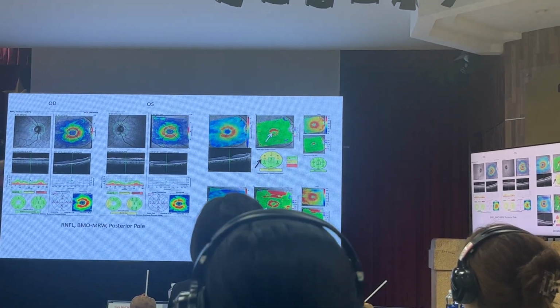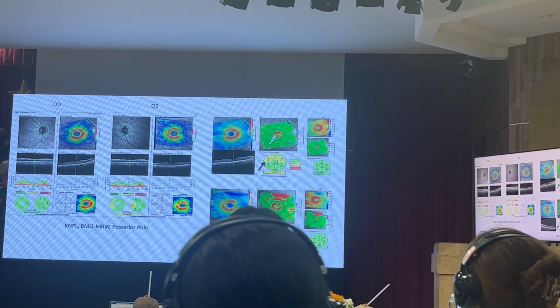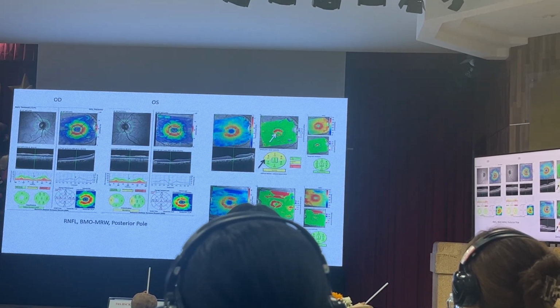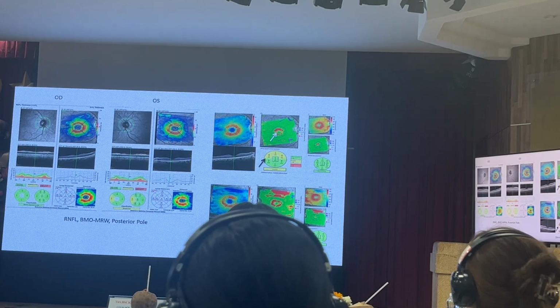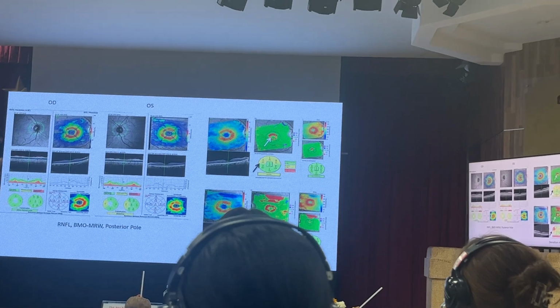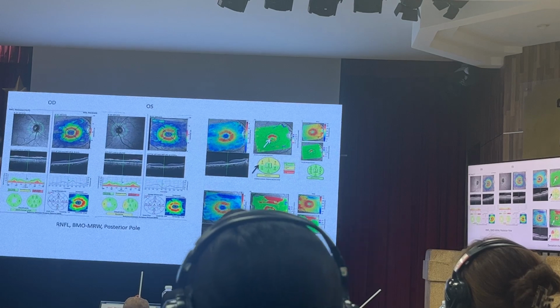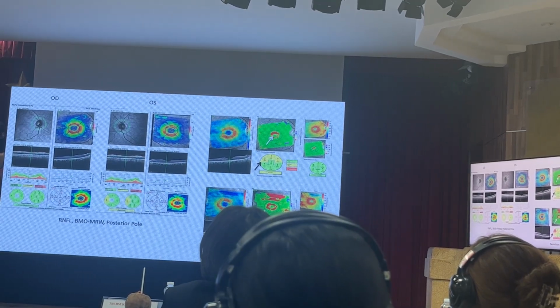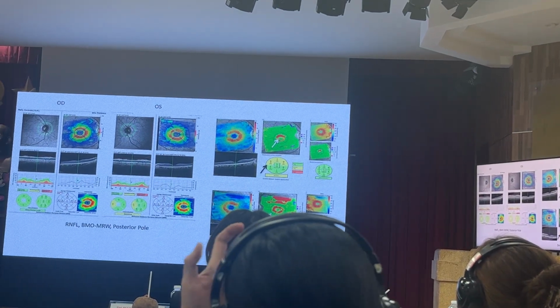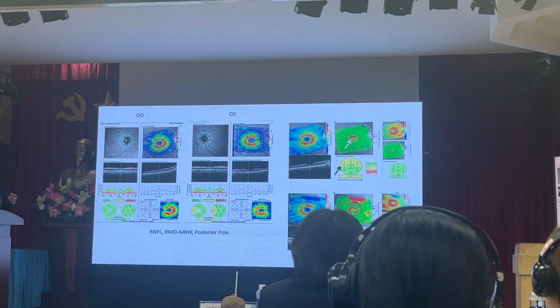And we tried to do that and looked at the nerve fiber layer, and what we saw is a suspect sector on the left-hand side nasally, but when we looked at the ganglion cells, we saw a beginning red circle sign, not complete, but more complete on the left-hand side, indicating that the patient really has a problem, and that there is a correlate for her functional complaints. Therefore, this was the reason we sent the patient for a neurologist checkup.